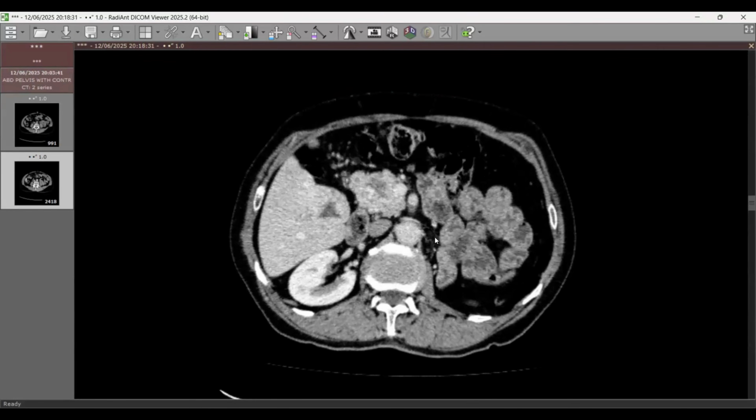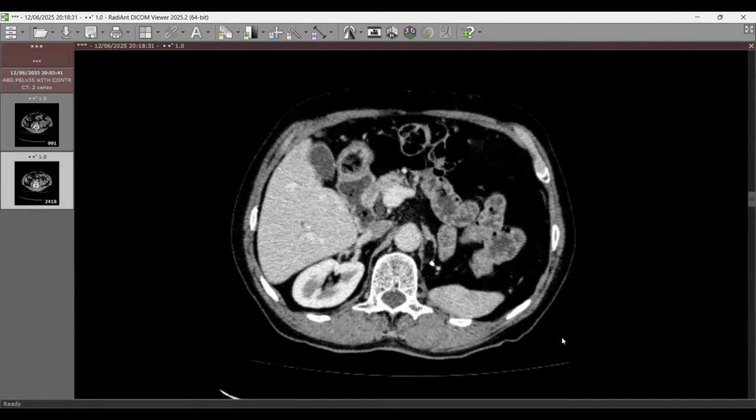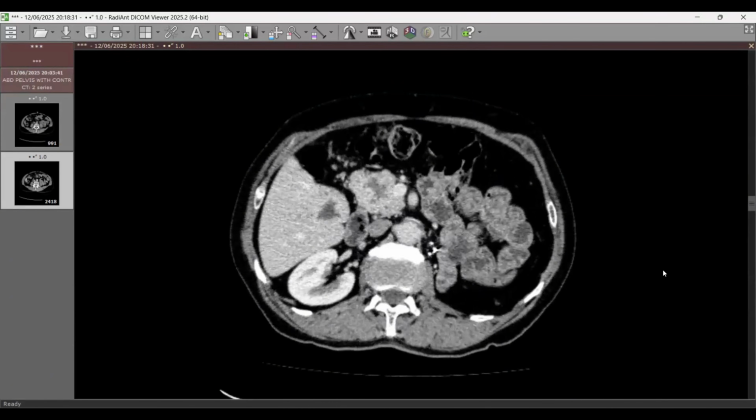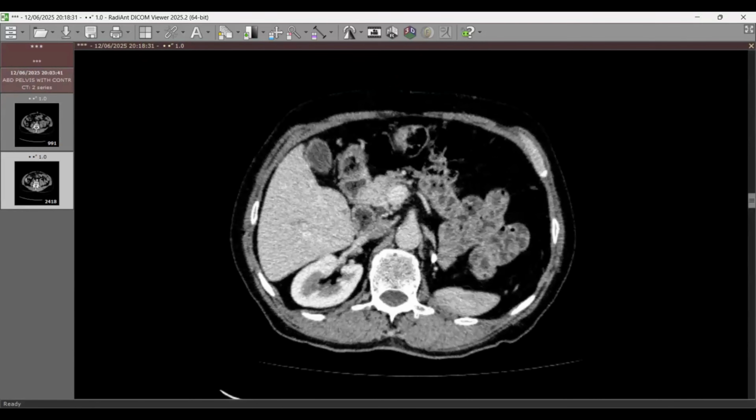And instead there were surgical staples. Can you appreciate the surgical staples here? Yes, sir. Now I can. So these were all mets. So what do you think the whole process is?